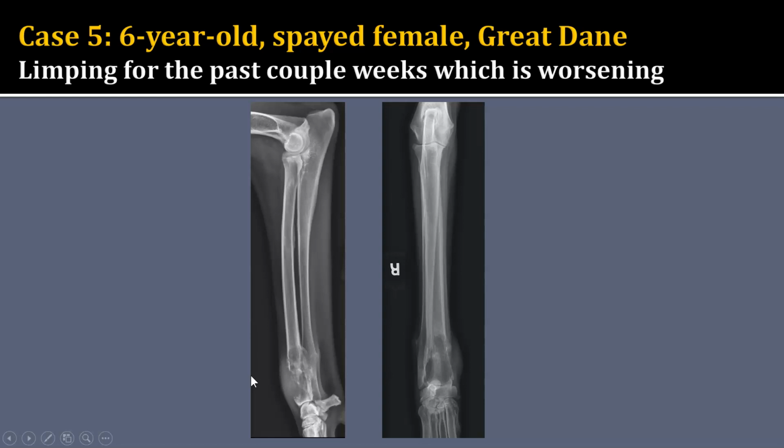And in this middle-aged to older Great Dane, this would be very consistent with what a primary bone tumor would look like. So my primary differential is going to be a primary bone tumor of this distal radius. It's a perfect spot. It's the perfect large giant breed dog and the perfect age. Now, because we can't be specific, it is possible still that this could be a metastatic lesion. I would say that probably fungal osteomyelitis or a soft tissue tumor are less likely.